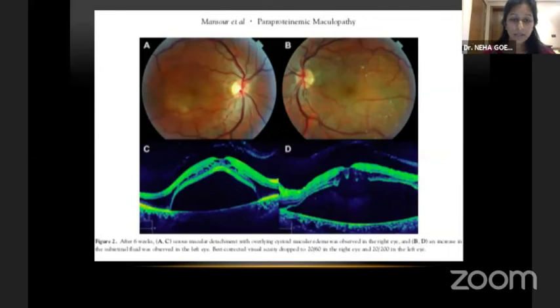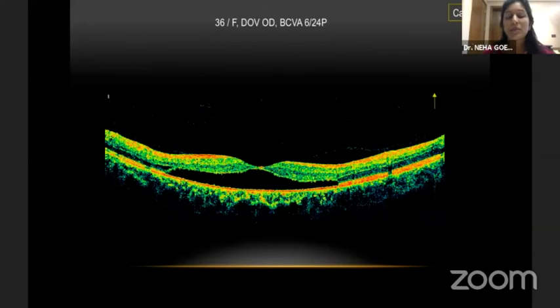So these are some of the pictures that you can see where you get these high NSDs and some hyperreflective deposits on fundus imaging. Now, this is important because it can be a clue to a systemic malignancy, and in conjunction with the hemato-oncologist, the patient definitely needs plasmapheresis and rituximab or chemotherapy. So this is something which should not be missed.